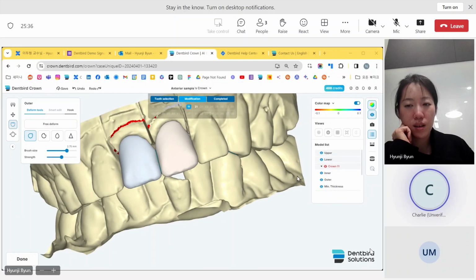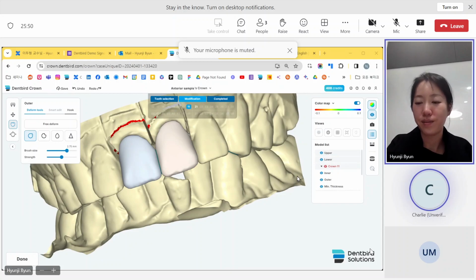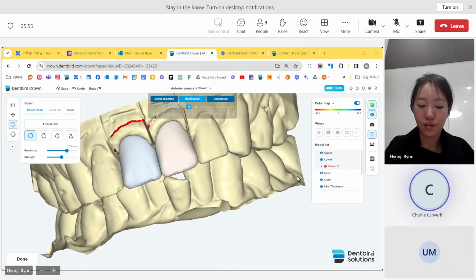A lot of dentists who don't concern themselves a lot about the outcome are using your software. And also I see the Japanese dentists are trying out yours. We have a problem, we want to do a markup, but we don't know how to design. Yeah, this could be an idea.